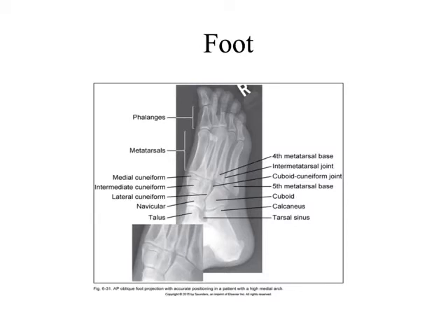Now we can see a little bit more of the calcaneus. Again, uniform density, we don't have quite as much of that wedge shape here because we've created an angle now that's going to minimize that. So we don't need a compensating filter on this kind of image. Let me see.